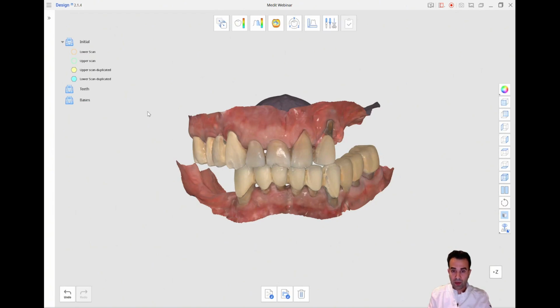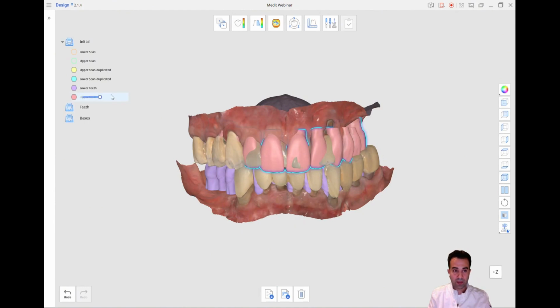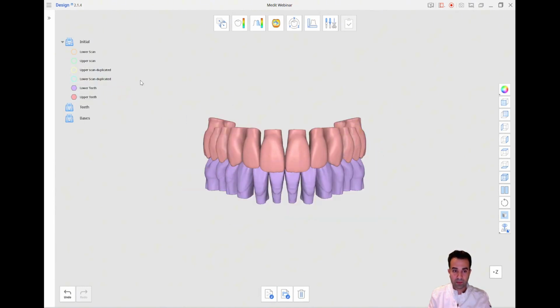Because the project will be large, we need to keep organizing our meshes into groups. In that order, it will make it easier to trace.